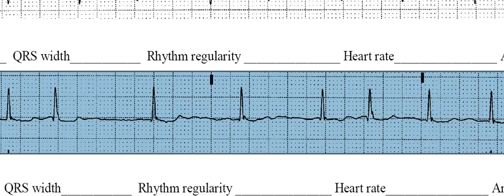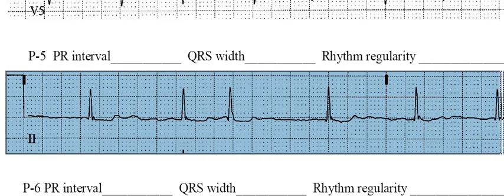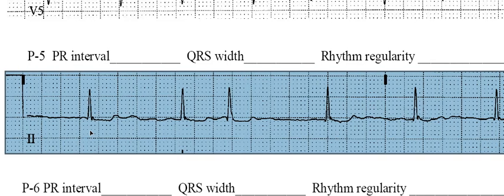Okay, I'm not finding any P waves here. A P wave is a thing that comes before the QRS, stays the same each time, is in the same place each time with the same PR interval, at least at this point in our course. We don't have that. There are no P waves here. So, your first strip with no P waves. So it's not going to be sinus anything when we're done with this.